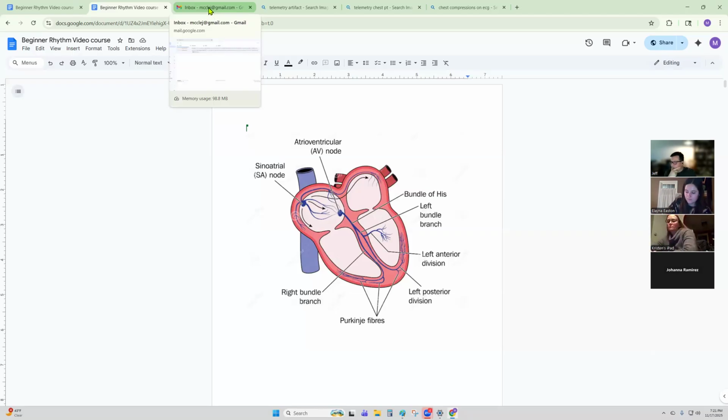Let's see. So sinus pause, asystole, and really we use asystole and sinus arrest interchangeably. Anything over 4 seconds, you're not going to sit there and nitpick about what's the difference. You're going to call a nurse and say, hey, you might want to check on this patient, right? And if for some reason nothing comes back, you call whoever your resource is and say, hey, things are happening or not happening in this room. So really, it's just more of a long rant than anything, the difference between sinus arrest and asystole.